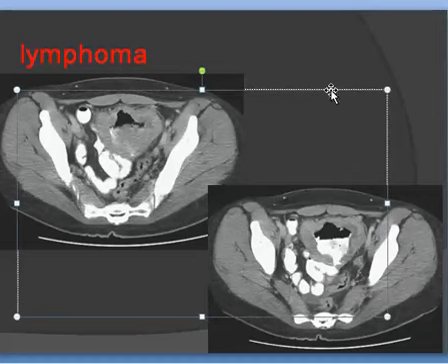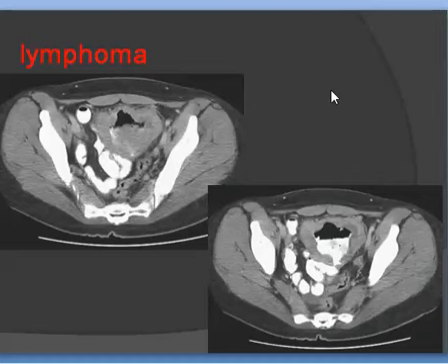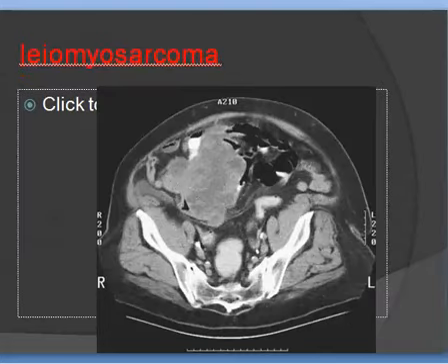Among the appearances, besides narrowing, nodules, masses, and exophytic tumors, is also the presence of aneurysmal dilatation due to large masses, which are excavated and continuous with the lumen of the loop. Of course, fissuration is another possibility.